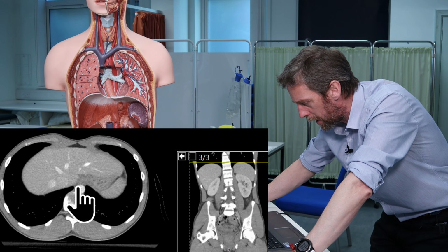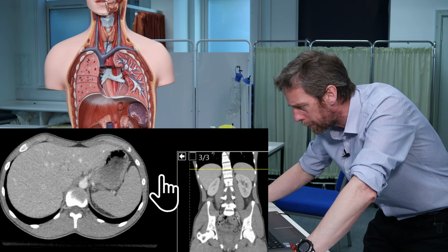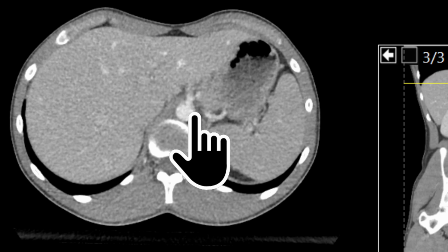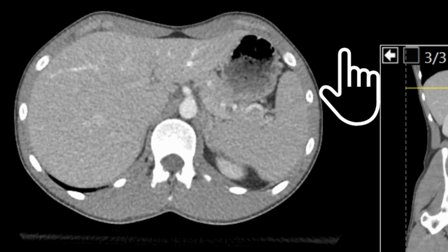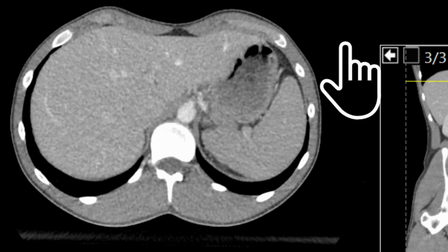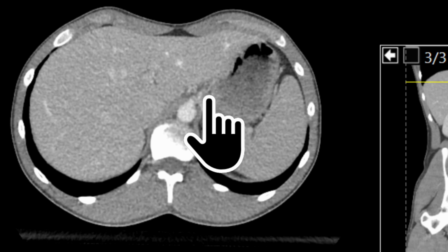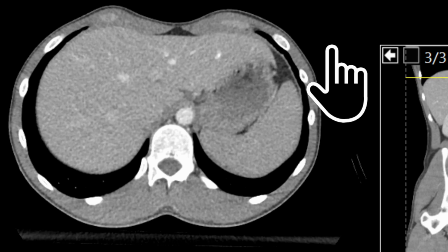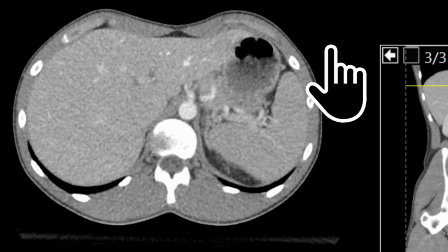Right, we've got our nice round abdominal aorta. It's passing through the diaphragm, and it's giving off a branch here. This is the first anterior branch of the aorta. So what is that first abdominal branch, that first anterior branch of the aorta? That is the celiac trunk, and that is where we see it, as soon as the aorta goes through the diaphragm.